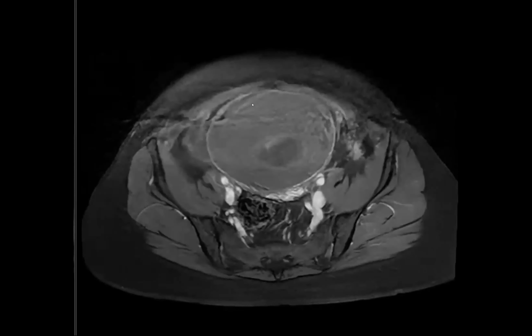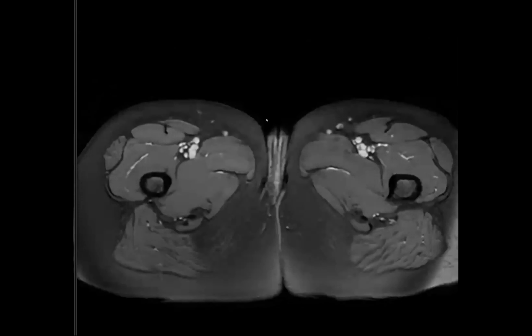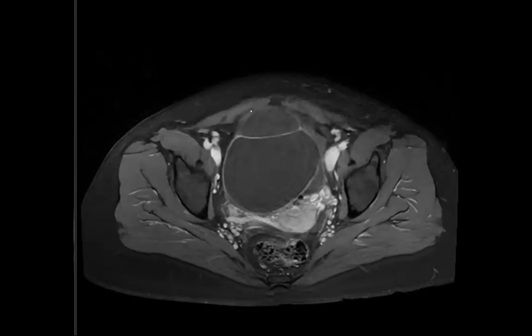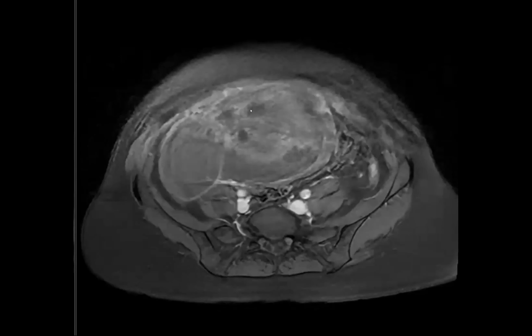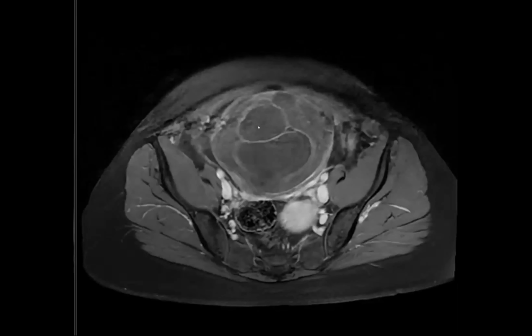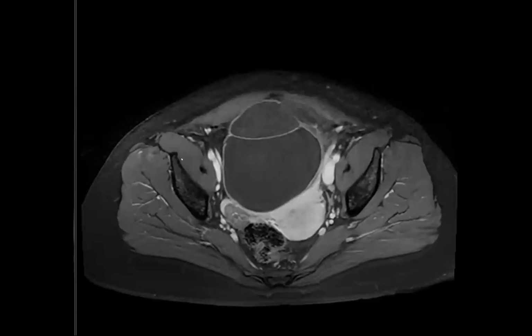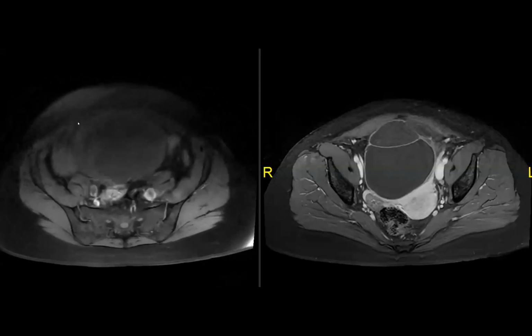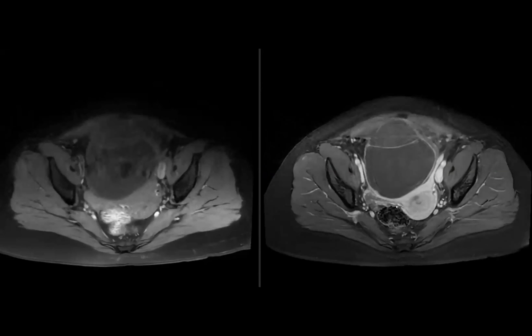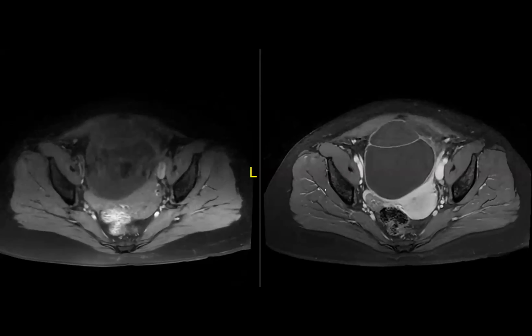Another interesting part is that there is a Brenner tumor somewhere in this big thing. So it's a left adnexal, left ovarian borderline mucinous tumor with a background of Brenner tumor, which, knowing that it's there on pathology, I don't know where it is on imaging. Another interesting thing here is that the right ovary is described to have a Brenner tumor as well. And I wasn't sure, maybe this is it, but really this is not callable prospectively.